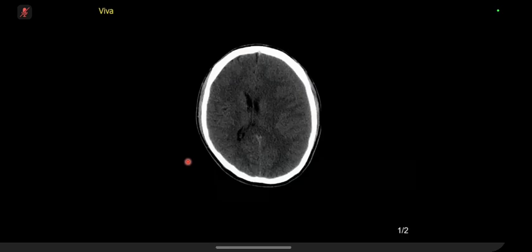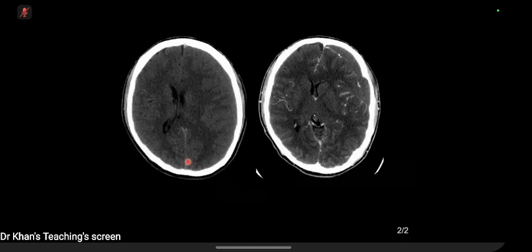I think there is a hematoma along the left convexity with some mild... Actually, it might be because they're so isointense and there's no midline shift. Could it be like bilateral isodense hematomas? But there's definitely something along the left convexity I can mildly appreciate.